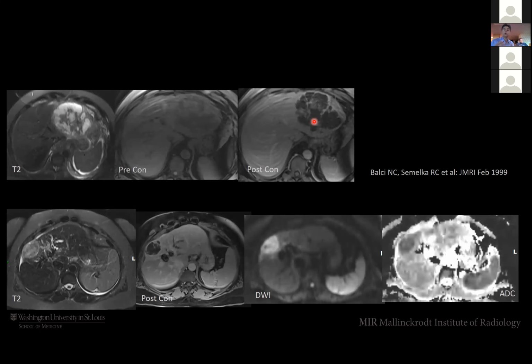An abscess is necrosis or breakdown of the liver parenchyma, right? The breakdown will never happen homogeneously. The breakdown will happen in areas or in pockets. So you have areas of viable hepatocytes, or they can show up as enhancing septations. So you should not exclude an abscess in that situation. If you don't know the clinical history much, how the patient is behaving, you may not be able to say, yes, this is a definitive abscess, but you should also consider abscess in the appropriate situation, particularly in a patient with a white count elevation.